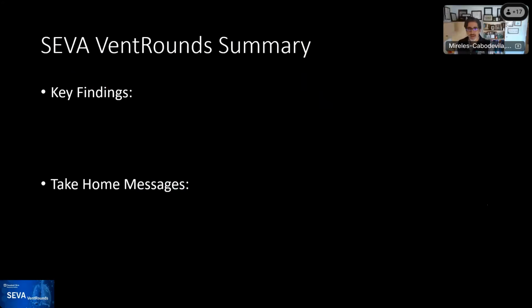Very good. All righty. So the key findings for today are that we reviewed the importance of recognizing the patient-triggered markers. And these are very varied and different between ventilators, and you need to review each one of them to try to figure it out.